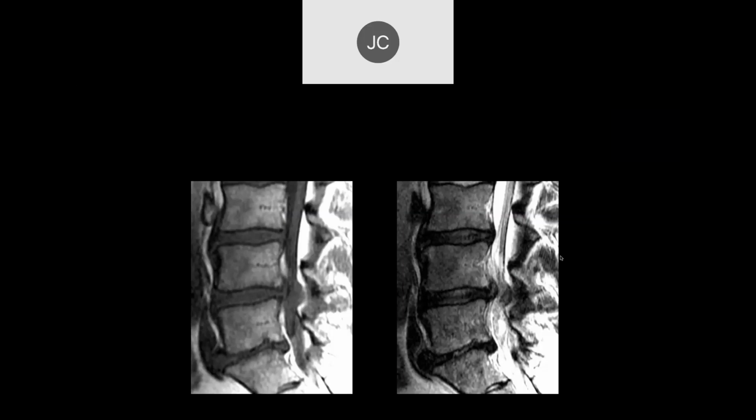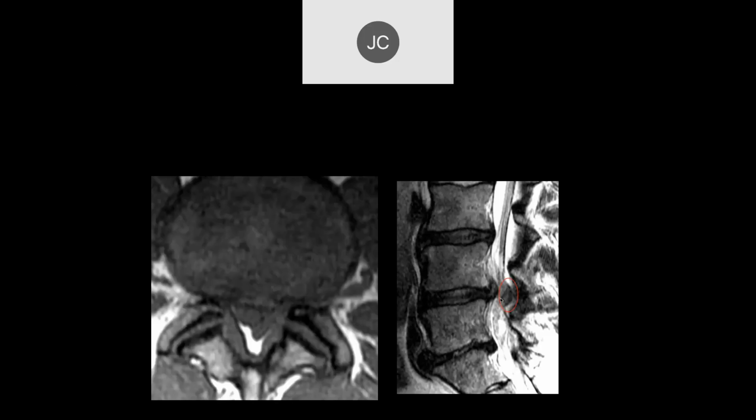Okay, who's next? I think Robert? So we got a couple of sagittal images here of this spine. It looks like there's some extruded material into the spinal canal. See, there's a distribution there, but it's this funny thing back here. Yeah, it's going to be a sequestered fragment. Okay. So, yeah, what's this thing there?